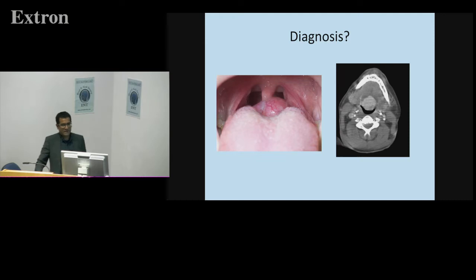So the next one is lingual thyroid. I've seen probably about three of these in my ENT career. Normally you can see them when you get them to open their mouth, or certainly you should see them on flexible endoscopy if it's small. And it has a classical appearance. Even those of you who've done thyroid surgery, this is what the capsule looks like. Quite vascular. So for that, the CT with contrast usually gives you the diagnosis.